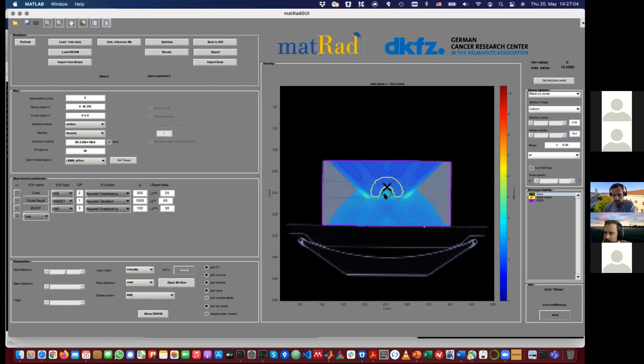But for instance, what you see here is in the core structure, where we have the dose tail, we still have a relatively high RBE, therefore also a non-negligible dose. But in general, you see that if you walk along the beam, from the entrance towards the end of your beam, then the RBE increases with depth.